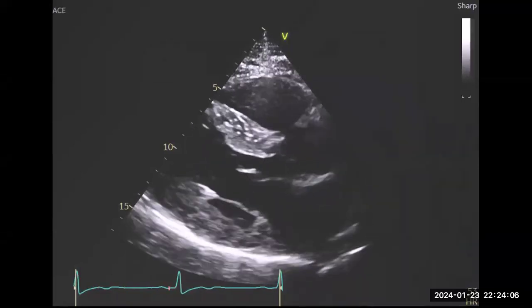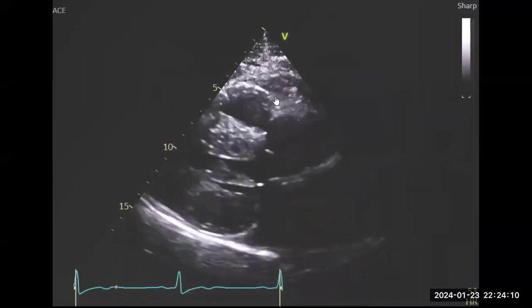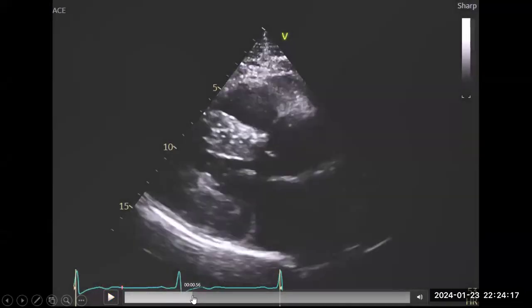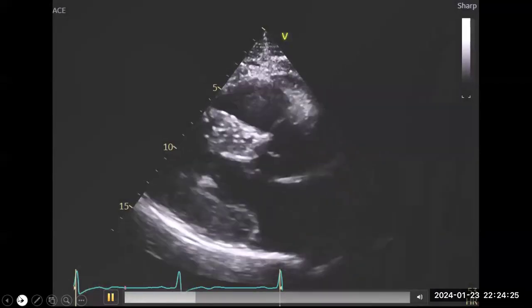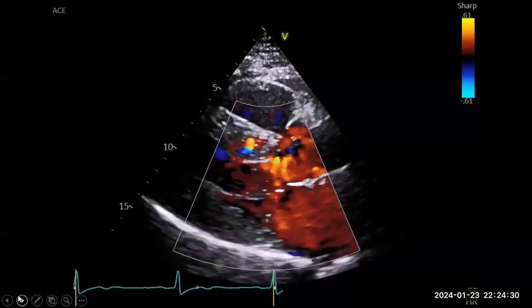Okay, excellent. I think the SAM here is very obvious even without M-mode. You can see it, am I right? This is one of the very clear SAMs that you can see even without M-mode, but as Abdurrahim mentioned, I will show you the M-mode now. Continue, Abdurrahim. What do you see here?